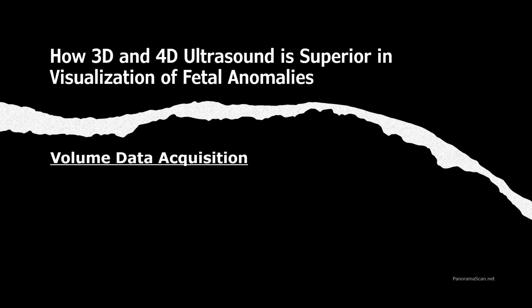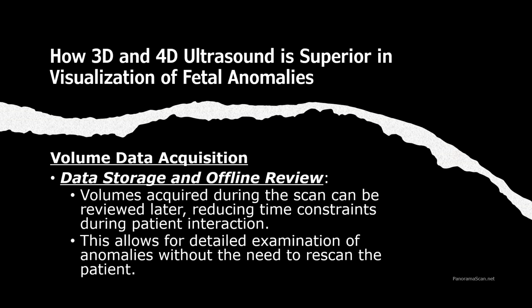Volume data acquisition is one of the key benefits of 3D and 4D ultrasound that sets it apart from traditional 2D ultrasound. Data storage and offline review. This is one of the advantages of 3D ultrasound, where the volume data acquired during the scan can be stored and reviewed later.